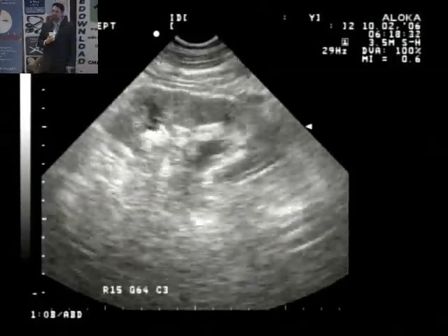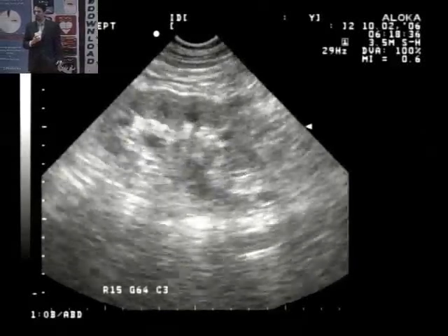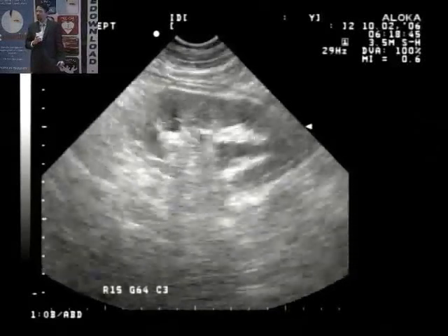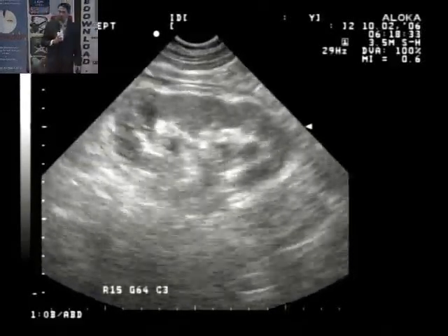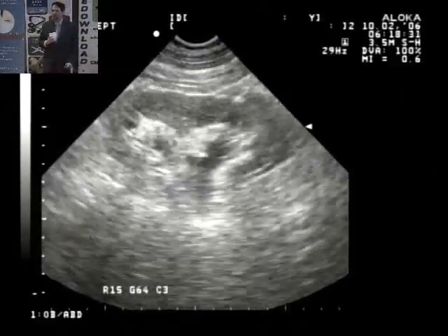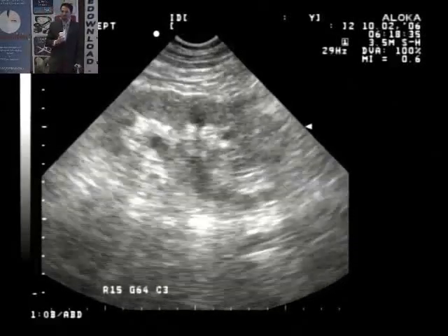Abnormal kidney. This is on the left side because there's no liver. You've got to look at the outer portion of the kidney, which is a normal appearance. It's gray, it's dark. And then you get a white central portion, which is being pushed out by the fluid that's backed up into the kidney. So this is mild to moderate hydronephrosis. Notice also that the fluid forms this tree-like, broccoli-like structure. That tends to do that.